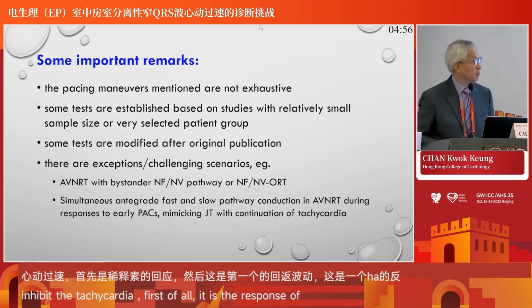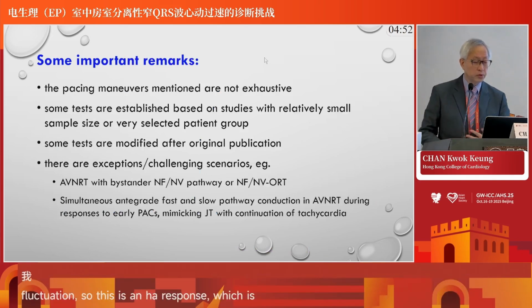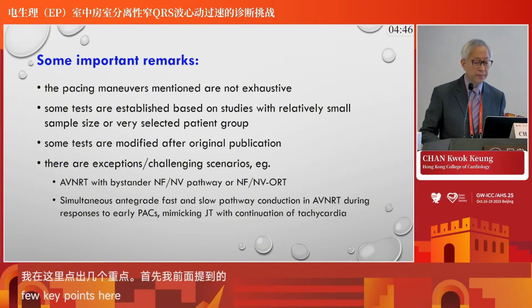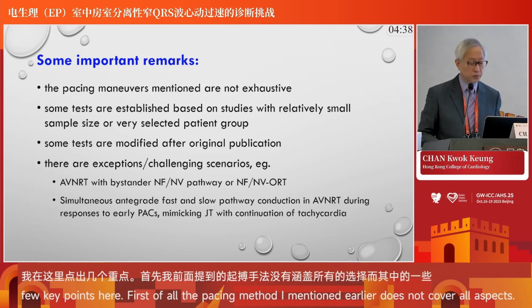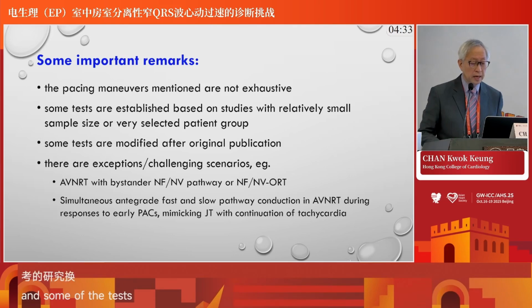Now, there are some important remarks for the above discussion. The pacing maneuvers mentioned above are not exhaustive, and some tests are established based on studies with relatively small sample size or very selected patient groups that may not be generalizable. Some tests were also modified after the original publication.